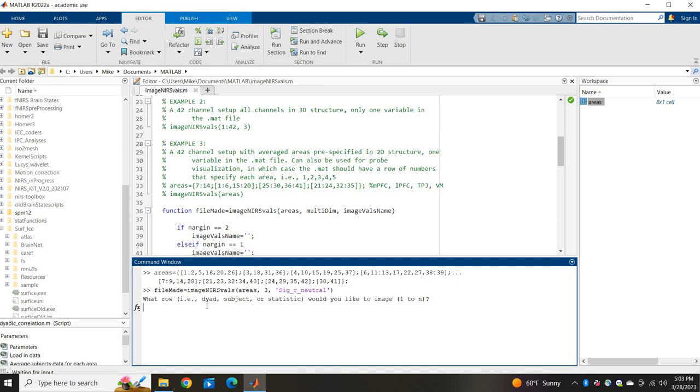Or maybe you want an example of a dyad that had really high synchrony, so you have to know ahead of time that it's dyad 52 you want to image. In this case, I had 63 dyads, and on my 64th row I have the averaged synchrony for the entire group. So if you're doing something like that, make sure you know what row it's in.